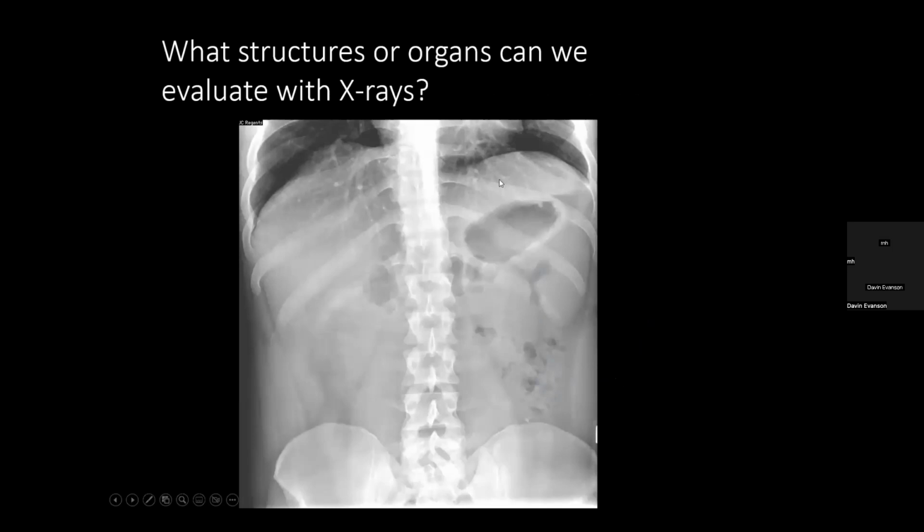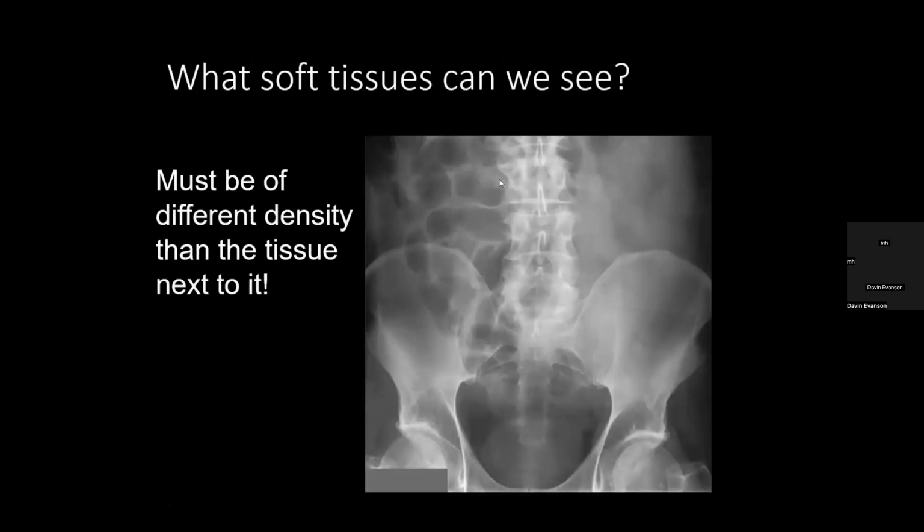We'll talk about how to read an abdominal radiograph later, but stones, bones, mass and gas, you'll hear me talk about that. You can see different structures. It's going to sort of go through these. You can pause this.